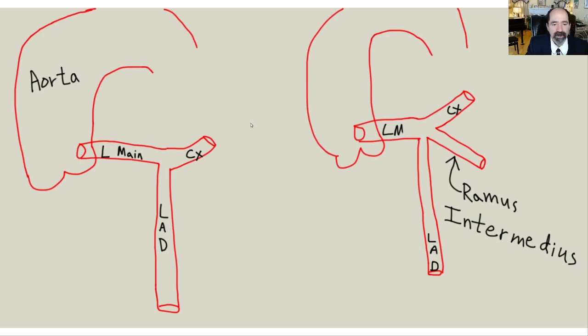All right, now I'm just going to show you one in the coronaries, and I don't do that much. You know, in my fellowship in vascular disease at Brigham and Women's Hospital, I used to dictate cardiac caths. So I was a lot more interested in this many years ago, but the point I want to make is here's typical anatomy. Here's the thoracic aorta. Here's the left main coronary artery. That's the one they call the widowmaker, the big one that feeds into the left circumflex artery and to the left anterior descending artery. This is a typical bifurcation. Atherosclerosis tends to happen at bifurcations. This is a hot area for atherosclerosis.